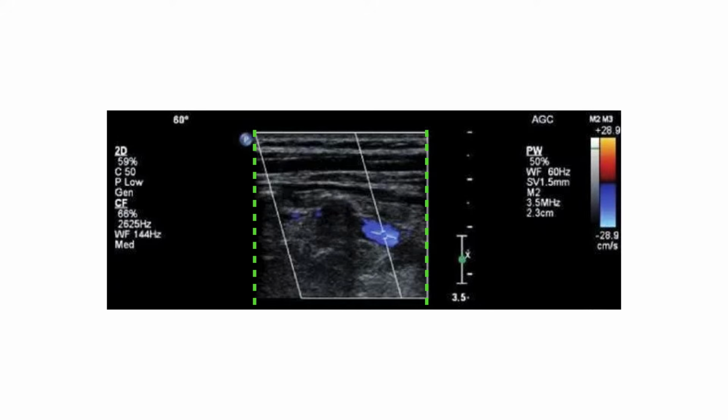Okay, so we've got our lines. Let's figure out where our transducer is. The one that falls outside of the box. There's our transducer on that side. So we've got a blue vessel, which corresponds to the bottom of our color bar. So that means this flow is going away from the transducer. There we go.